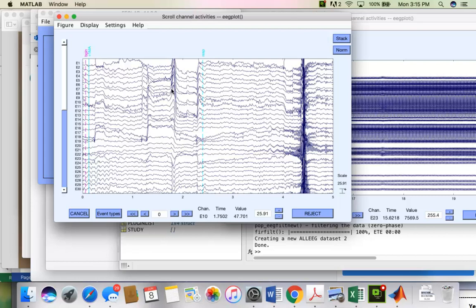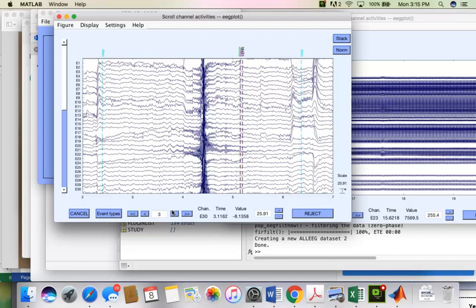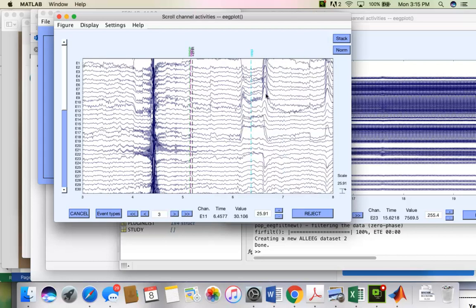This tends to be looking from left to right, sometimes up and down, sometimes a combination of the two. These areas right in here, this is the EEG signal. So it's kind of a randomized signal, has quite a bit of different frequency content, appears to be completely random. Okay, and you can see these eye blinks, they show up quite a lot.